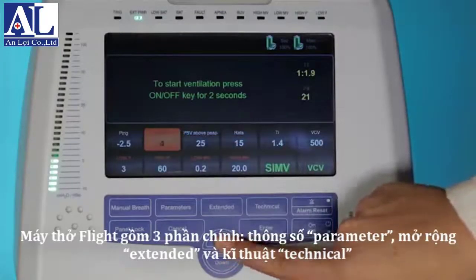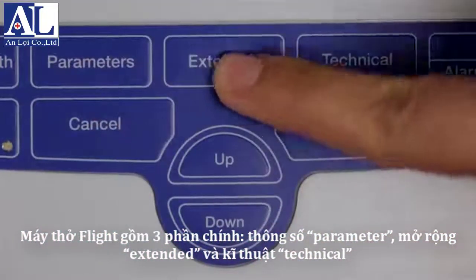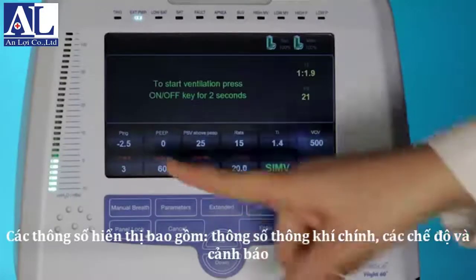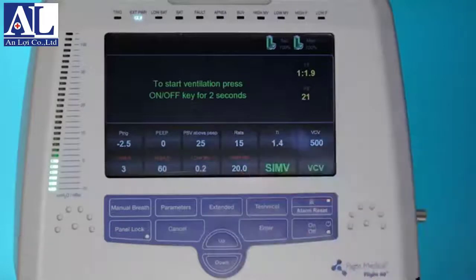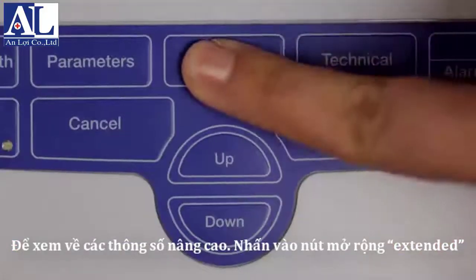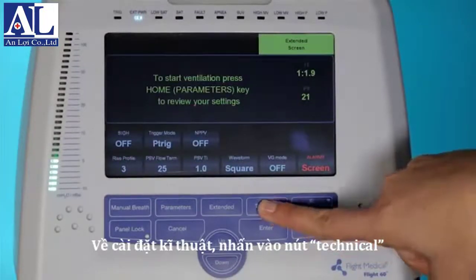The Flight 60 has 3 main screens: Parameters, Extended, and Technical. The Parameters screen displays the main ventilation parameters, modes, and alarms. To view more advanced parameters, press on the Extended screen button. For all technical settings, press on the Technical screen button.